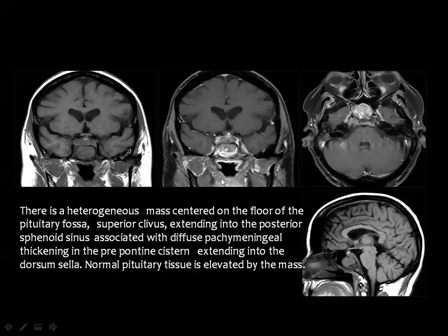And here you see the tumor of the previous case. It shows low signal in the T1, intermediate signal in the T2, and this is post-contrast, heterogeneous post-contrast enhancement. This is T1 and this is T1 sagittal image.